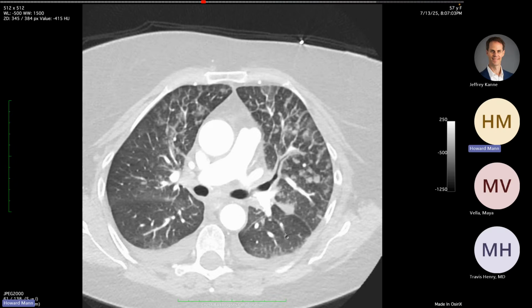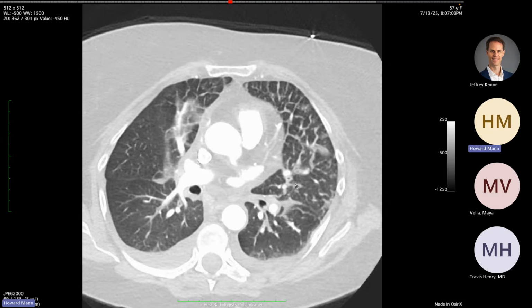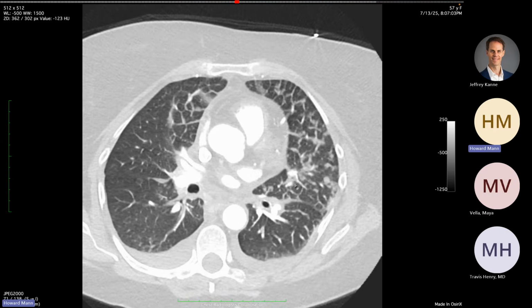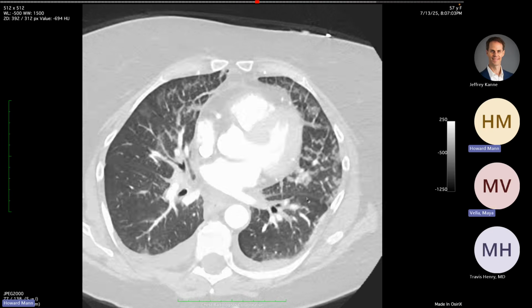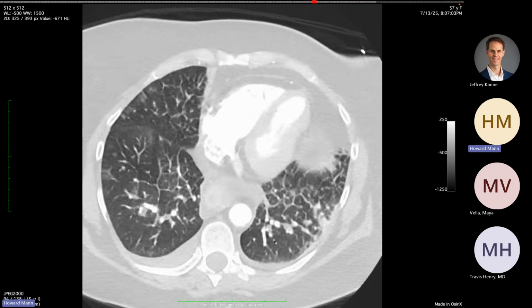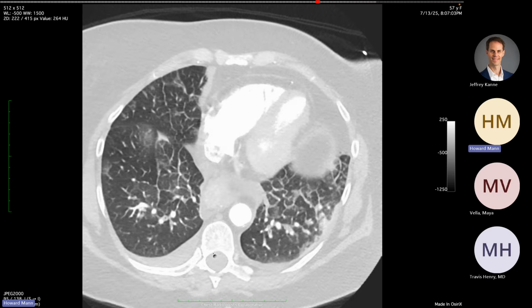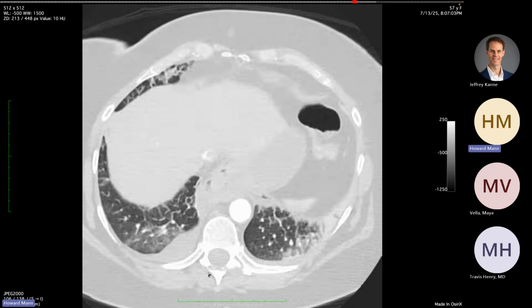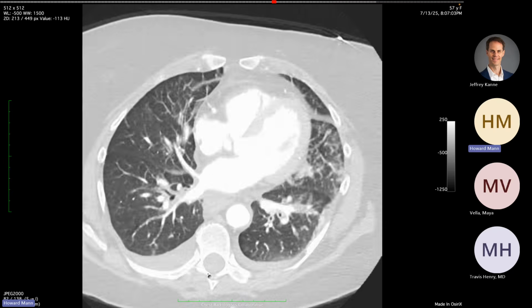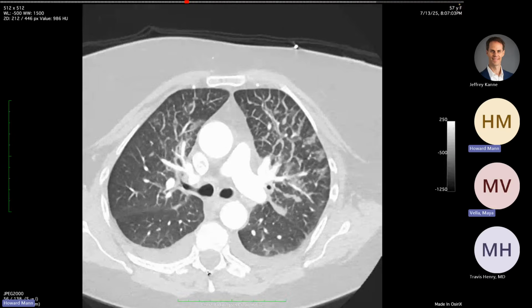This was initially described in a paper from Belgium as lymphatic pearls. We decided it's unlikely that these represent fluid distended lymphatics, but rather fluid distended interlobular septa that produce these nodular opacities. Other signs of interstitial lung edema, florid peribronchial fluid cuffs down here. And we also have pleural fluid, small, right more than left, and an esophageal hiatus hernia. So, in summary, the findings are those of florid interstitial lung edema.